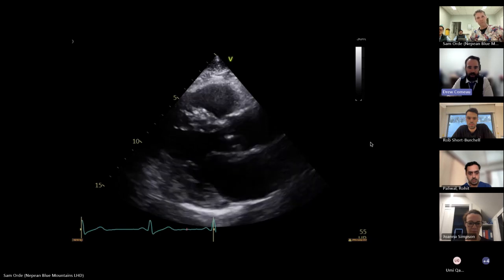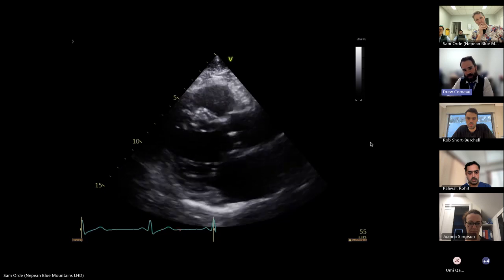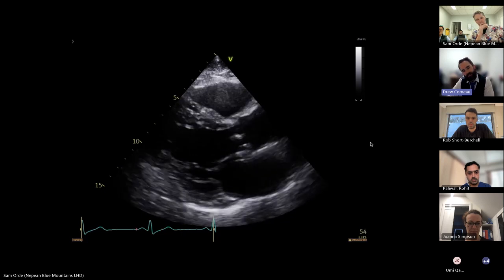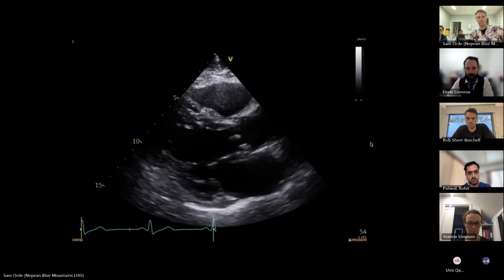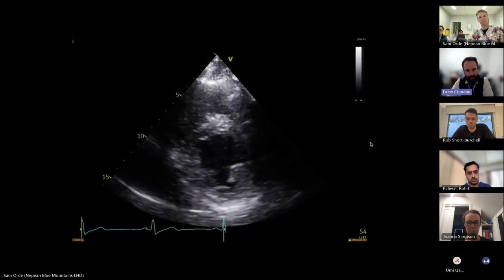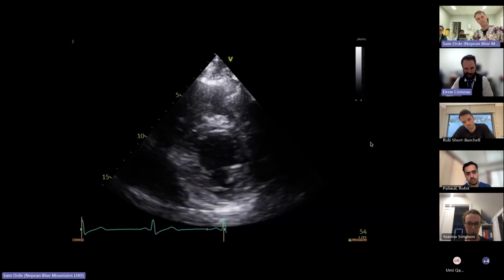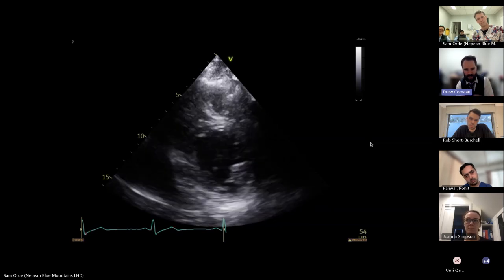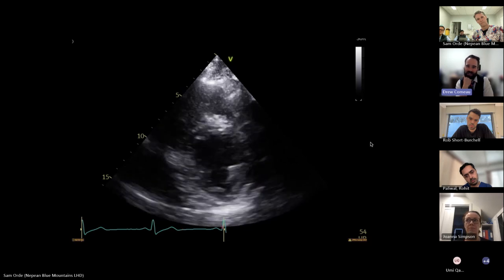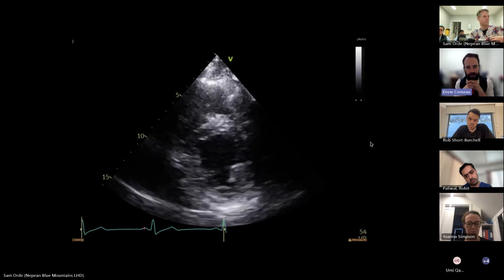So when we talk it through, in the parasternal long axis view, hypokinesis, and maybe some thinning in the basal inferior lateral wall. Happy to move on. Yeah, so it's circumflex potentially. So short axis view. Again, in the inferior, there's hypokinesis in the mid-inferior wall. This is kind of like a PDA, posterior descending artery, depending on the dominance. Continue.